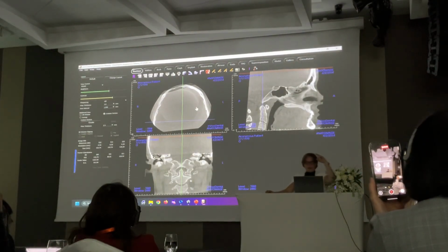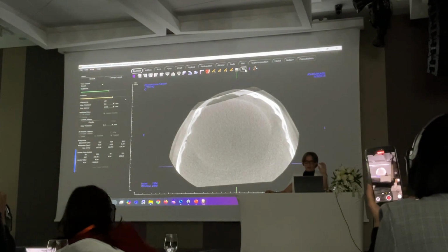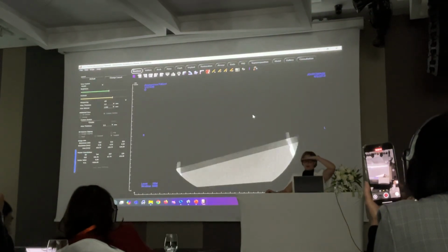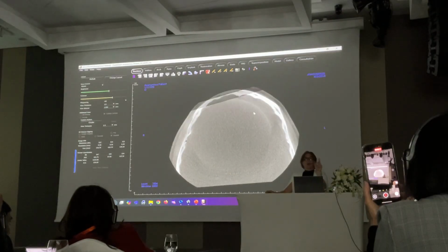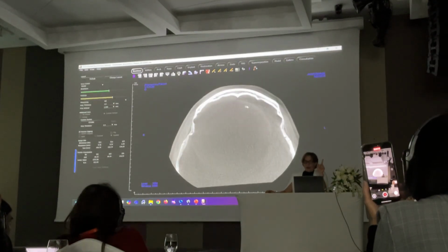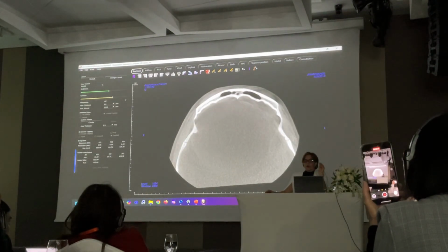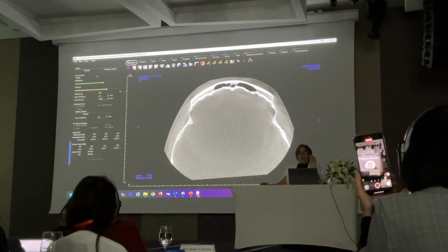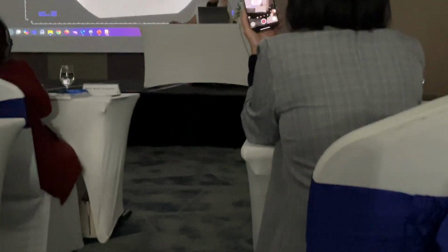We're going to go to the top of the scan. I'm going to get rid of all these distractions, top of the scan. Moving downwards through the scan, I'm going to look for the first black thing. The black things that appear first are going to be the frontal sinuses. These frontal sinuses, and any sinus should look like this, black on white, okay?